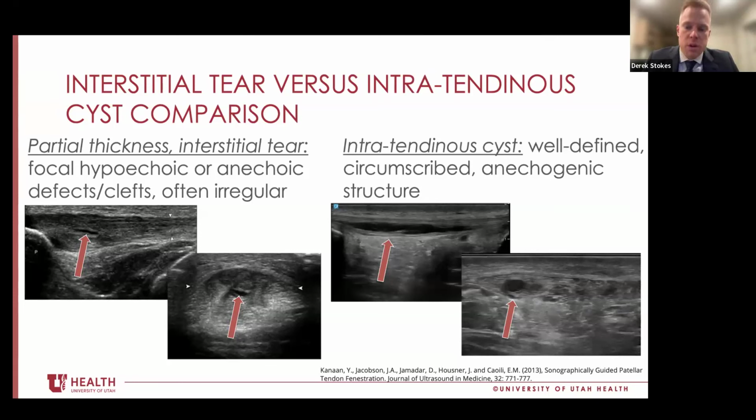We were also able to see this delamination process that occurred, kind of a collapse on itself, so that we no longer had this sustained shape, but actually still had some hypoechogenicities that showed kind of where that delaminating defect occurred.